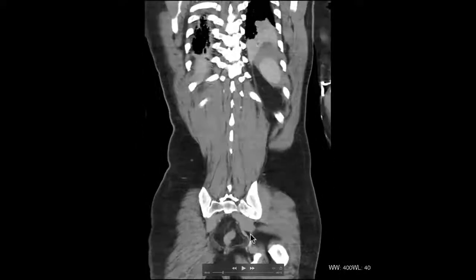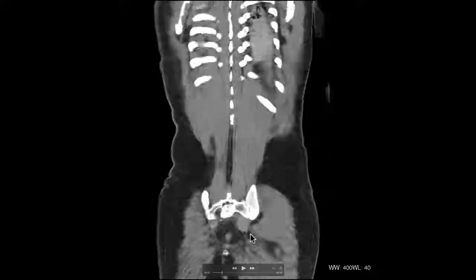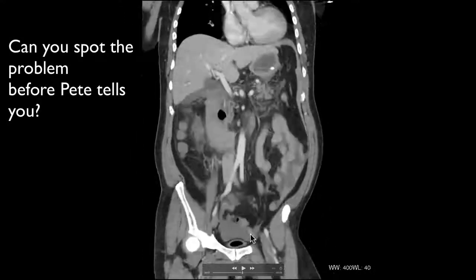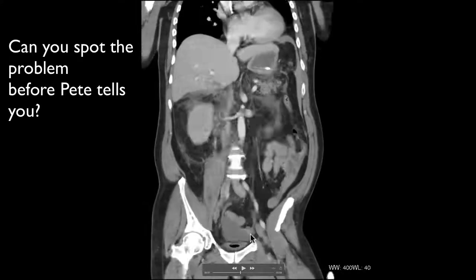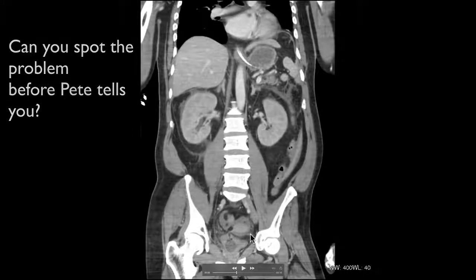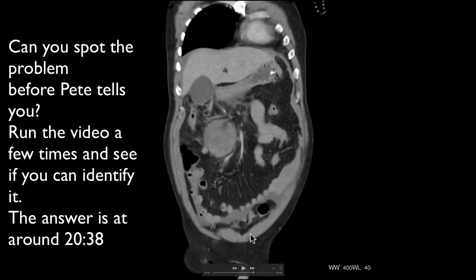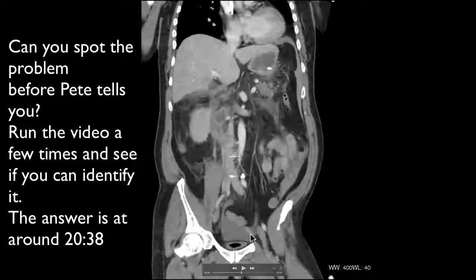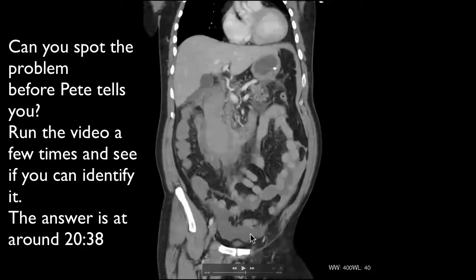So this is a patient who came in with acute pancreatitis and wasn't very well. A lot of abdominal pain, obviously, but also a drop in the haemoglobin, so we did a CT scan. There are obviously lots of different types of complication of pancreatitis you can see on CT. You can look for biliary dilatation, you can look for pancreatic necrosis, pseudocysts, other collections, inflammatory masses, that kind of thing. The other important thing to look for is vascular complications.